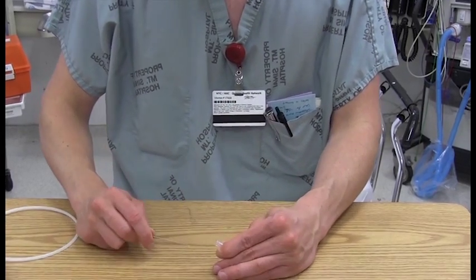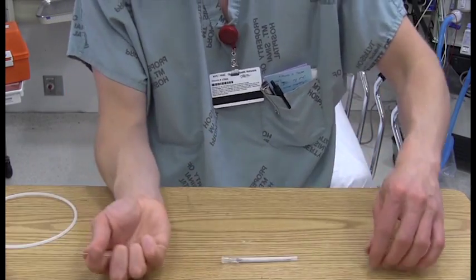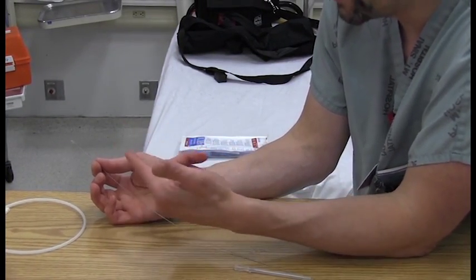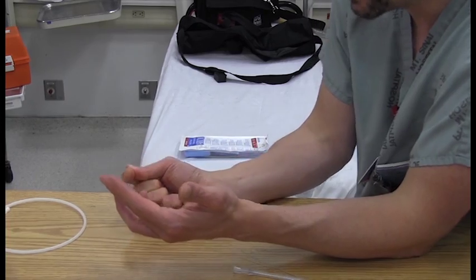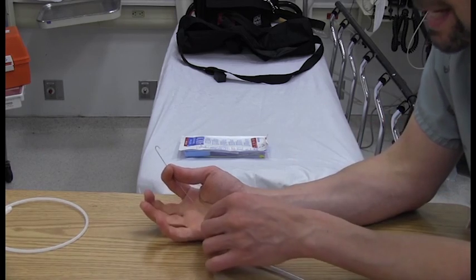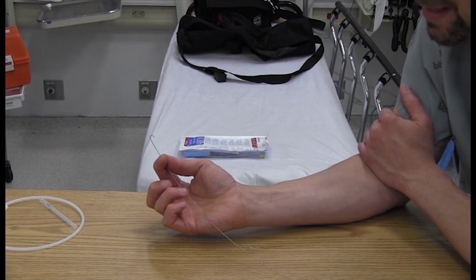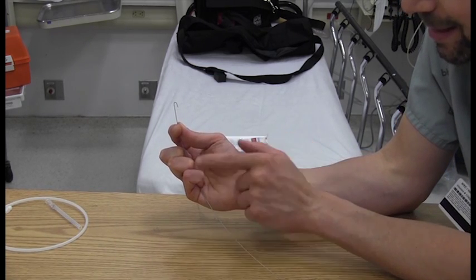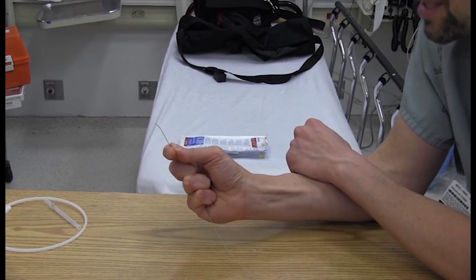So what do you do in those circumstances? Well, you want to straighten the J-tip. Now, this is kind of tough to learn, and I'm going to try to explain it, but you really have to try it yourself to truly understand. The J-tip is a coil around a central solid core. And what you could do is if you hold the wire steady, you could actually advance the coil while leaving the wire stationary. So the movement is you actually grip the wire portion at your hypothenar eminence with your pinky and ring finger, digits 4 and 5, and you lock it to your hand. So now it's locked to my hand. Now with my thumb and index finger, I advance the coil. And so that's the move.